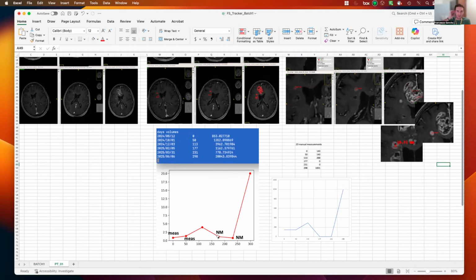And all of this volumetric quantification of the segmentation corresponds to tissue that is either pericavitary, so like at the border of the surgical cavity, or somewhere else, but it does not really constitute measurable disease. So we should not consider this volume. This volume should be considered as if it was zero in terms of measurable tumor burden for that time point. This is the agreement currently for RANO 2.0 that we still have to confirm that there is manually measurable disease before we even look at what the segmentation says in terms of volumes.